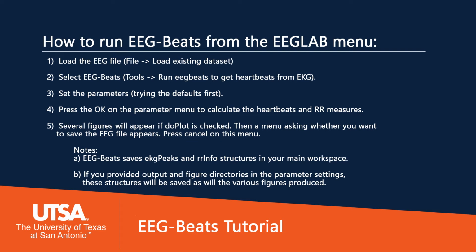After finding the heartbeats, EEG Beats calculates RR measures and plots. EEG Beats also returns the calculation in the workspace. The EKG peaks structure contains the peak locations, and the RR info structure contains the metrics. You will also see 4 figures, which we will explain in another video. If you set the output directory locations in the parameter settings, EEG Beats will also save the analysis and figures to files.